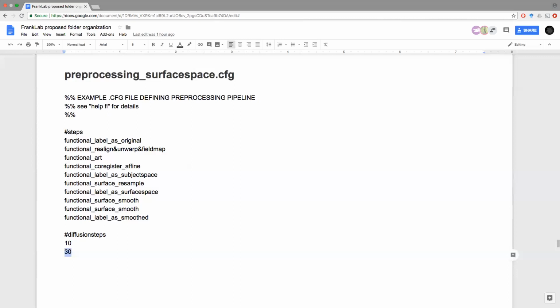If you are looking at something like speech minus baseline and you are trying to figure out whether the location of the responses looks reasonable, and you don't care that much about the actual amount of noise in your data, you just care about getting a sense of the rough location of the activation, then I would say look at the minimally smooth data, because that will give you more spatial specificity.